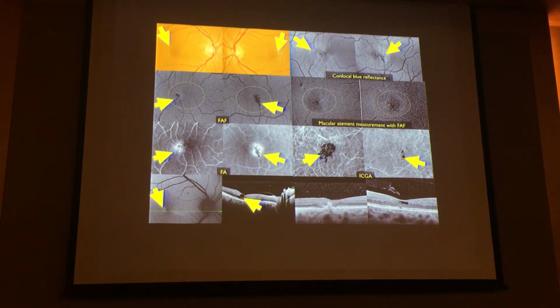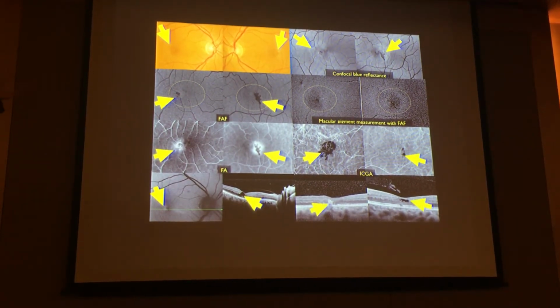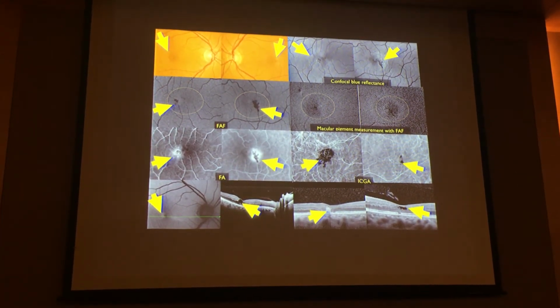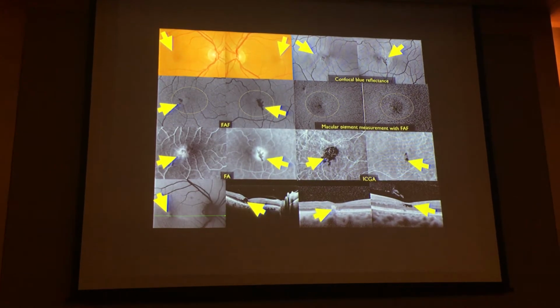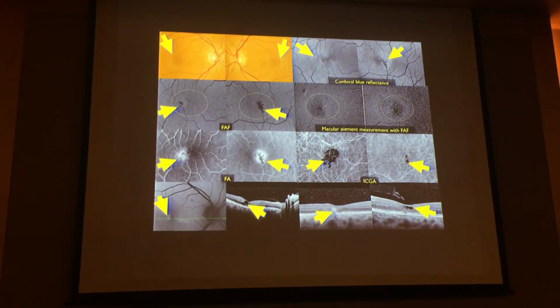And then you can actually have intraretinal cyst or mottling pigment in both eyes, or one or the other. So these are the possible characteristics, usually bilateral and almost simultaneous evolution in MacTel.